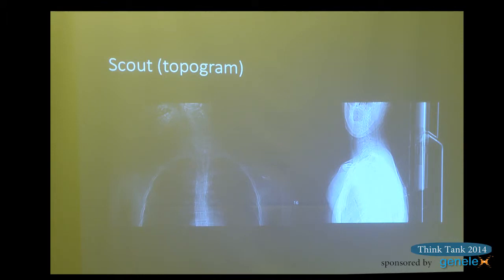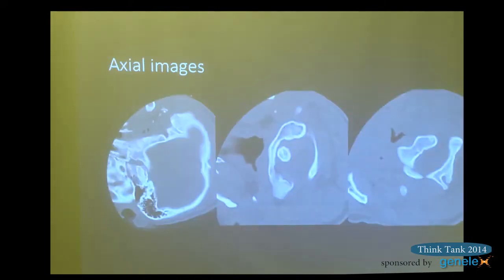If the ligaments loosen there, there's possibility for impingement. So this is someone laying on a CT table with their head turned as far to the right as possible. And this is a sideways view or reconstruction of that.